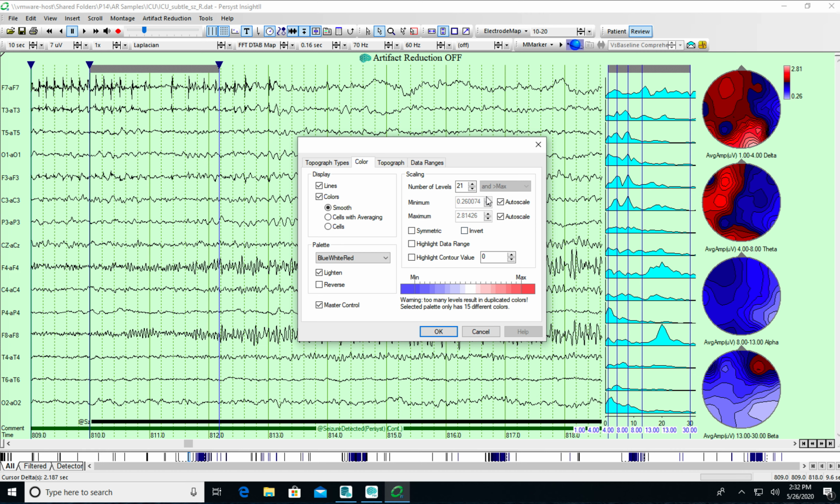And notice, importantly, over here are the minimum and maximum auto scale. So right now it's going to look at the min-max across the bands and scale it accordingly. And you may want to turn that off in certain applications if you want to see absolute changes in amplitude as you're moving through, because otherwise, as we go through this, you're going to see these scale values over here on the right change with every move forward.